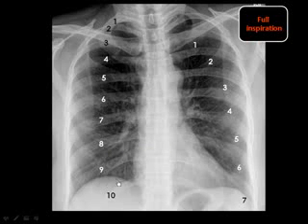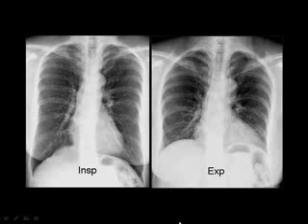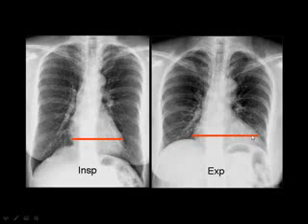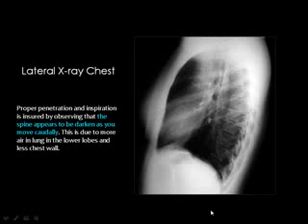If you see the diaphragm at this level, you know that the patient had a full inspiration, and this is an optimal quality radiograph. What happens if there is no full inspiration, or if the patient was exposed in expiration? Then you can see elevation of the diaphragm and flattening of the cardiac shadow as well, and you may misinterpret this as a left ventricular enlargement, for example.